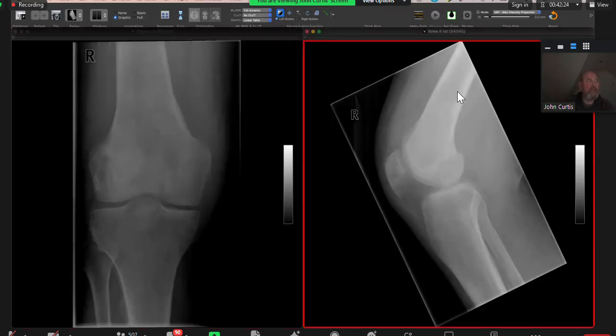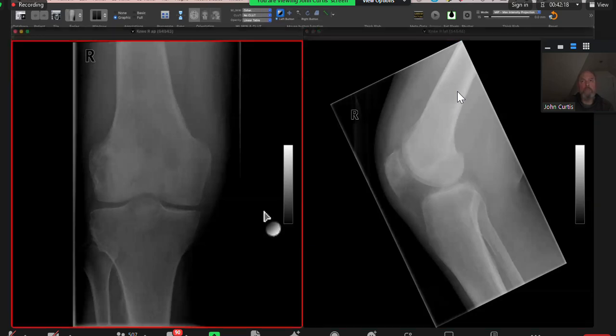Okay, this patient is complaining of knee pain. I have been presented with a right knee radiograph, AP and lateral views. I can see an ill-defined lucent lesion in this area. I can see an ill-defined lytic lesion in the distal right femoral epicondyle area.